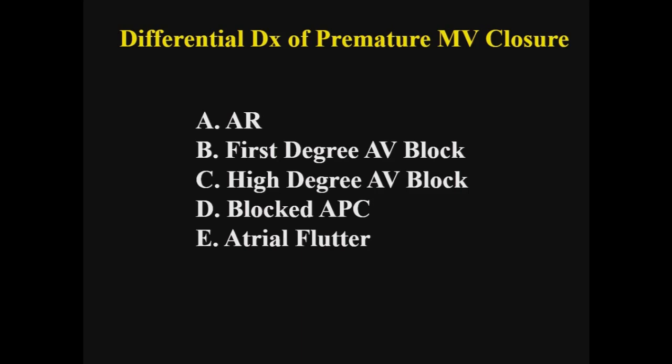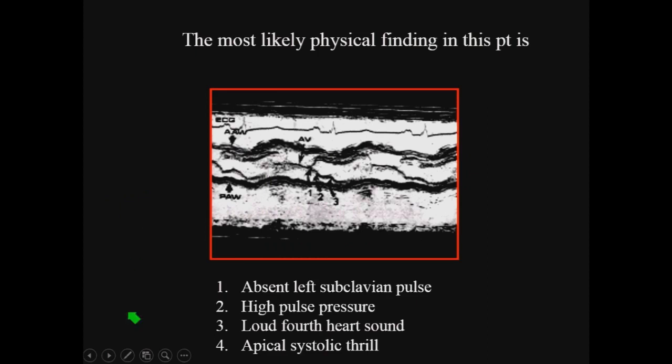Because in the meantime the atrium relaxes, and therefore the pressure in the ventricle after premature beat is now higher in the ventricle than in the atrium, and this causes premature closure of the valve. So you can see all kinds of differential diagnosis. It's not necessarily an aortic regurgitation. Remember that. Look always at the EKG, trying to make also electrocardiographic diagnosis.